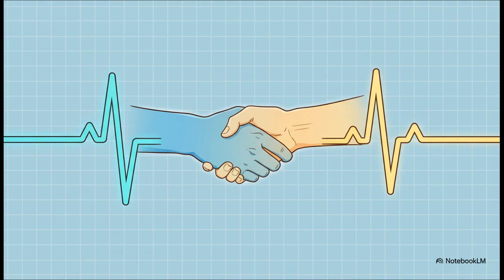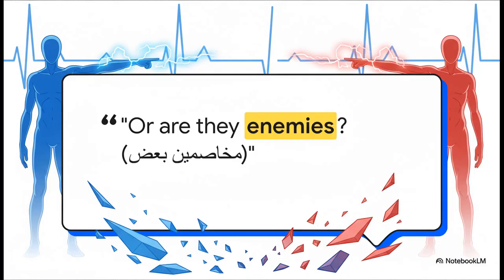Clinically, when you see this, you should start thinking about things like right ventricular hypertrophy or maybe even a pulmonary embolism. But what about the opposite? What if they're not shaking hands? Well, for that, we have our second mnemonic. Instead of shaking hands, you ask, are they enemies?